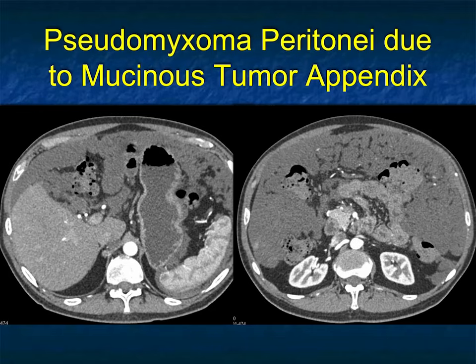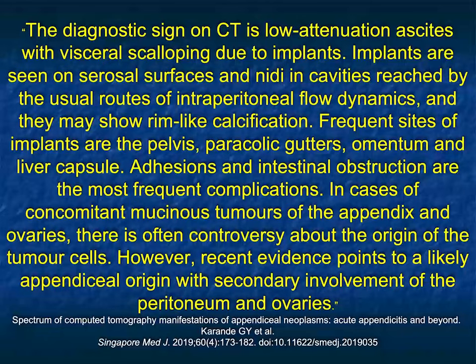So one of the things when you're looking at abdominal distension and looking for bowel obstruction that can sometimes, at least clinically, confuse you is pseudomyxoma, because there's such a mass-like protuberance of the abdomen. When you look at the bowel in this case, you see minimal at best dilatation, but it's the mass effect that's causing the problems. And appendiceal carcinoma can be a tough diagnosis.